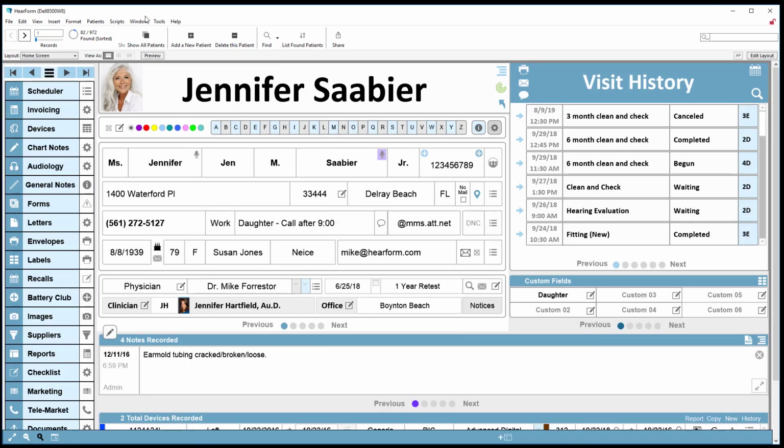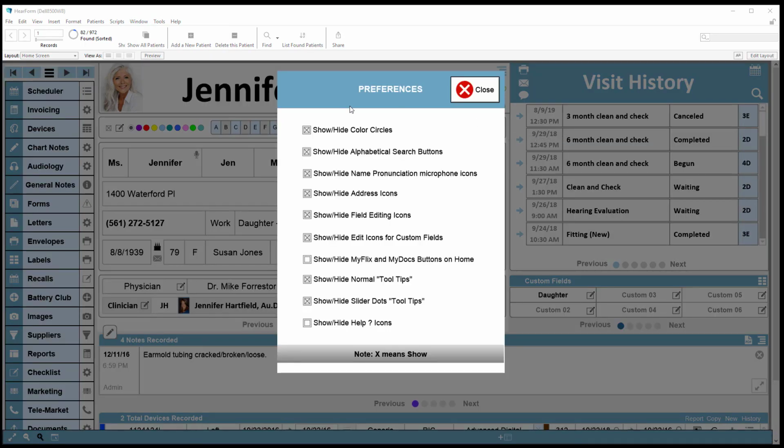Now I've already opened a window because that pop-up window is not movable. Let me show you what I mean because it'll come in handy later. I can't move that. That card window, as it's called, kind of slightly dims out the background, and it really places focus where we want it on the window itself. And yes, I can click a button right here, for example, to show or hide the color circles, but I can't very well teach you what's going on behind that.